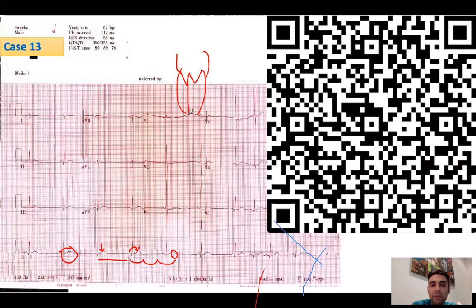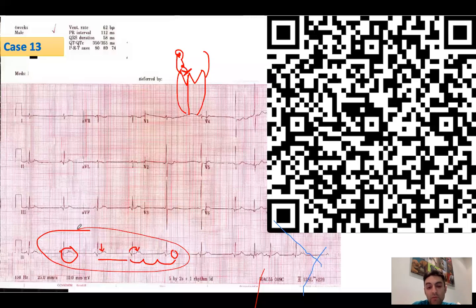So this is the sinus node, there's a PAC coming from here, it blocks here, but goes upwards and infiltrates the SA node, or resets it. So you get a compensatory pause, and then functional bradycardia. If this PAC conducts, then you get tachycardia. It's a different problem. This is a patient who is physiologically behaving like a 2-to-1 heart block or even complete heart block because it's bradycardic. But in this case, the treatment is not a pacemaker.